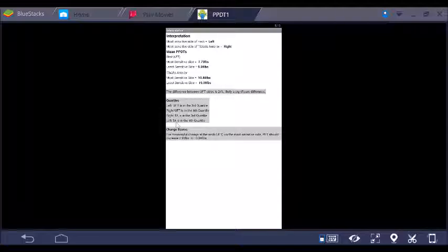Going further down then is the interpretation as far as quartiles. Now, as I said, this is taken from a large normative database, so we're able to compare this patient's scores against what we know of people with neck pain. Here we can see that the left upper traps is in the 3rd quartile. In other words, in the 50 to 75th percentile of all of the people in our large normative database. In this case, all the females actually in our large normative database. The right side is actually in the 4th quartile, or the highest quartile, that 75 to 100th percentile. In other words, neither one of these are suggesting the person is particularly sensitive at the neck.